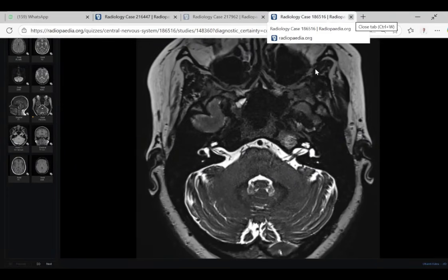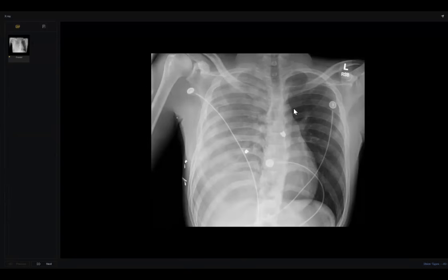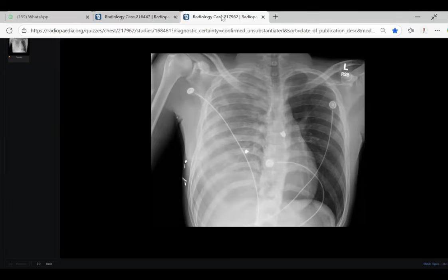Normally not enhanced, due to the blood-brain barrier. So when you find any enhancement of the intracranial part, I mean the intracisternal part or even the intracanalicular part of the facial nerve, think about neuritis, especially if this enhancement is uniform. Thank you, doctor, so much. Next candidate.